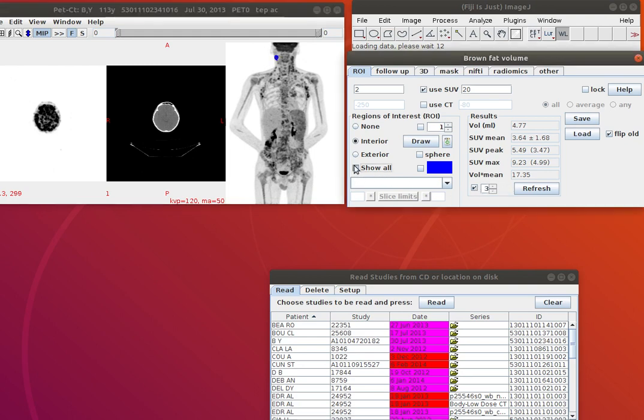If I want to see all the regions, here they are. But I want to see a particular organ. I want to see this organ. Okay. So I'll ask not to show all, but to track. I'll go through tracking. Okay, you can see it's number 13.